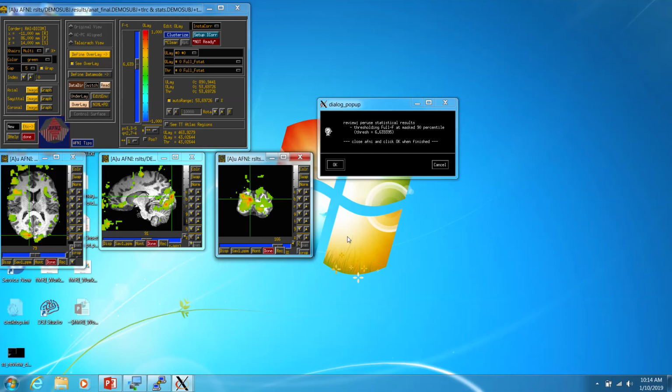We always look at this final positive control, something where you expect to see an effect. You look at all of the visual stimuli that occurred in the experiment, the model, and every single person that you run through should look about like this.